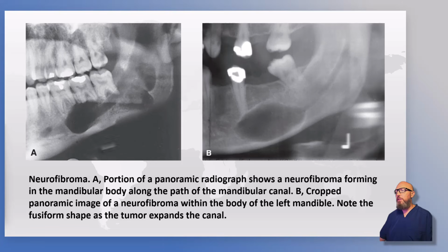So some examples of that. Everything about this looks just like your schwannoma, right? And so radiographically, we can't tell the difference. This one, though, it looks more serpentine. Maybe first on the differential, I would have a hemangioma, but think, yeah, it could be a benign neurotumor as well.